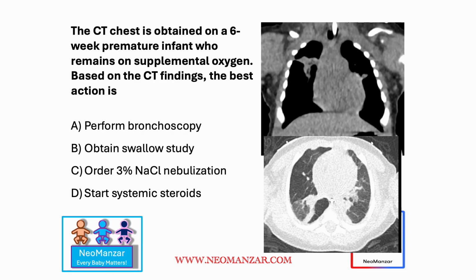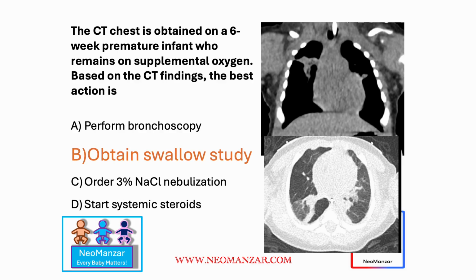So here we have a CT chest which is obtained on a 6-week-old premature infant who remains on supplemental oxygen. Based on the CT findings, the best action is... pause the slide, zoom the picture. What do you guys think? Okay, the correct response here is obtain a swallow study.